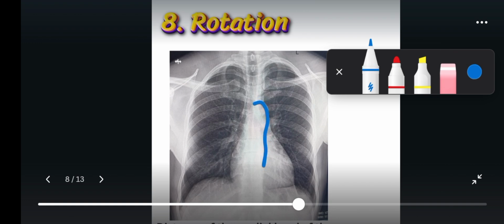See, this vessel is important. We use it to analyze. It is part of the features we consider in a case of hypertensive heart disease, the aorta, whether it's unfolded. So it can distort other structures and make them look abnormal. It can equally reduce the size of the heart or increase it, depending on how the rotation is.